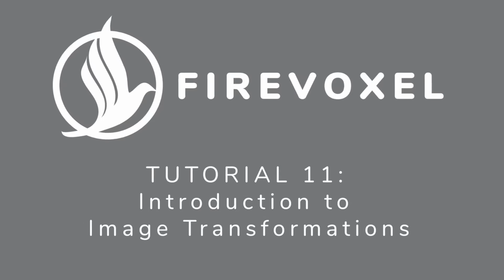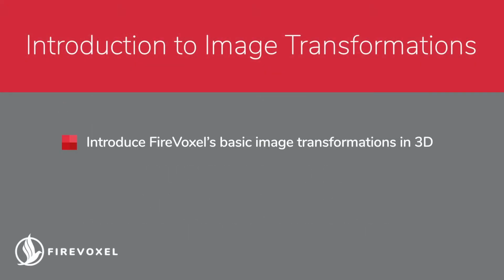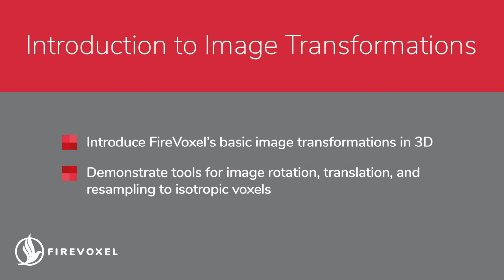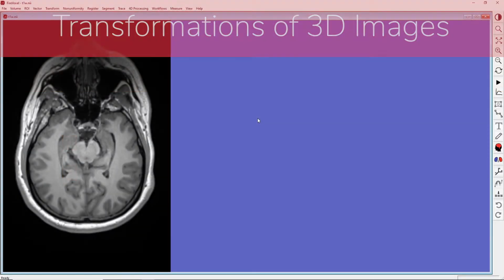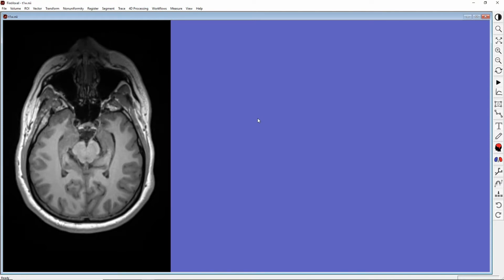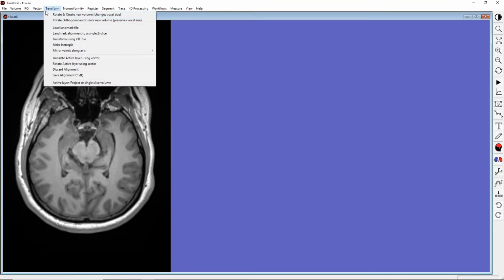In this tutorial, we will introduce FireVoxel's basic image transformation tools and show how to use these tools for image rotation, translation, and change of resolution. Superimposing medical images acquired with different parameters or different imaging modalities requires changing image orientation, position, and resolution. Here, we will introduce the tools in the FireVoxel's Transform menu for performing these actions.